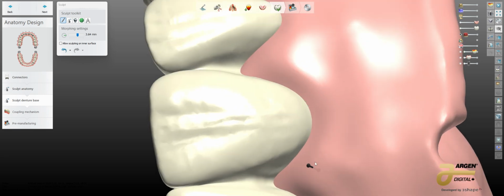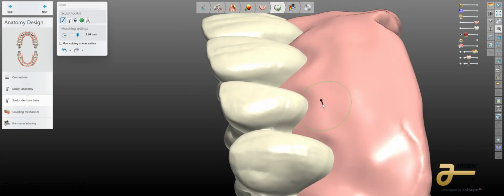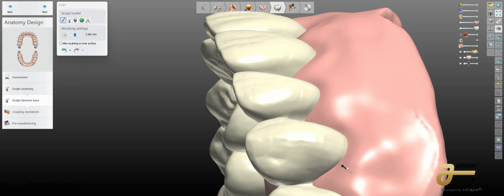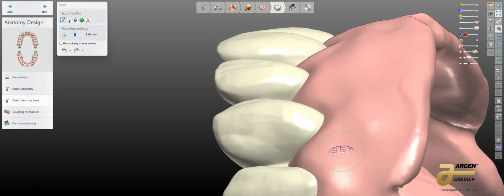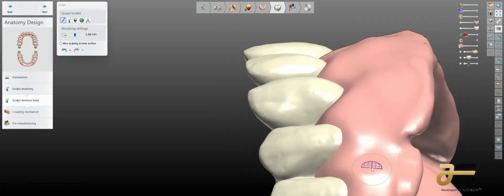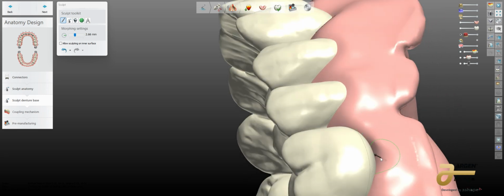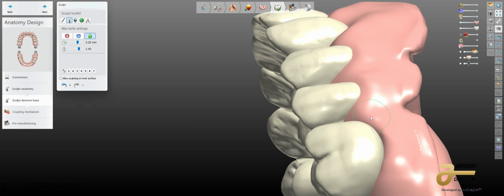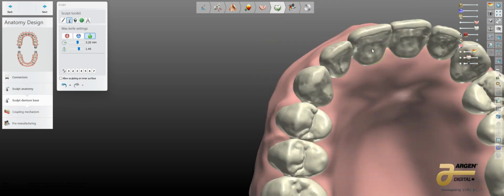And you can see from the angles that I'm working and why I'm pulling it in the directions that I'm doing, where I'm trying to get the eminence of the root form to come through and why. Well, all of this starts with years and thousands of dentures done by hand based upon my eye and where we're going to reduce the wax. And over the years in the analog fashion, well, hell, you didn't want to have to block wax it out to carve it all back. I tried to do it in a very additive way so that it was more efficient. It's no different in digital today. You can see I'm not spending too much time on this stuff, and I'm just getting it to look halfway decent here.